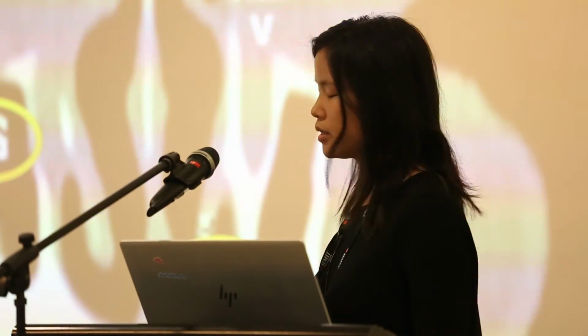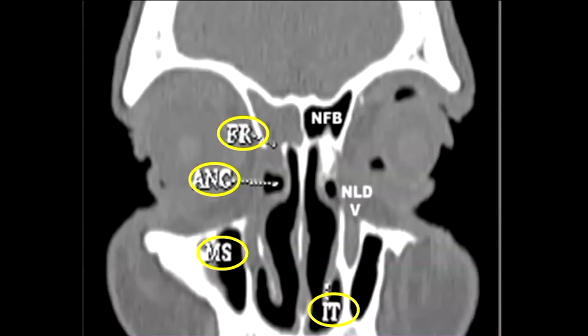Going a bit further back, this is a really busy slide, but it's actually one of the key slices. A lot of anatomy happening. So if we start from the top, you've got the frontal sinuses, and you can see that the sinus on the left side here is very, very full of stuff, so probably got sinusitis there. But at the top, it's always the frontal sinuses, and you can see that there's a subtle difference between the left side and the right side.